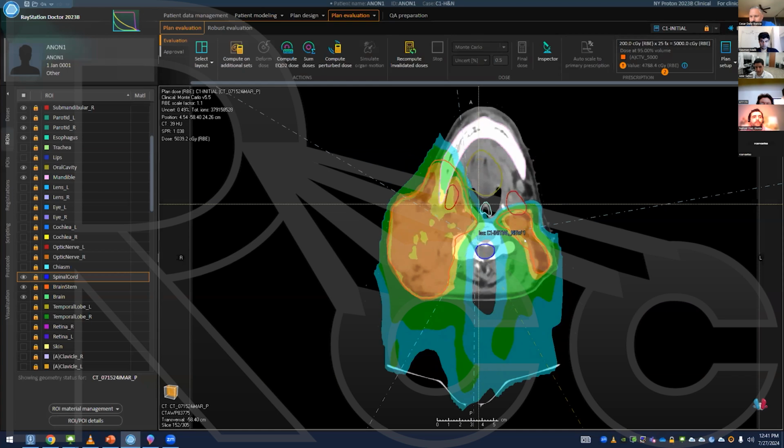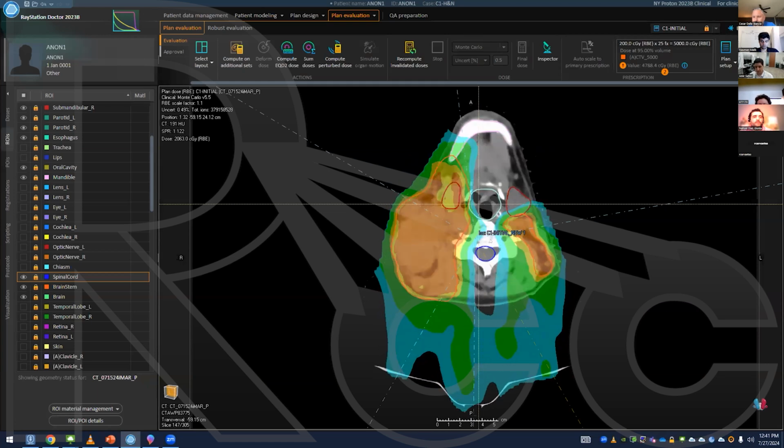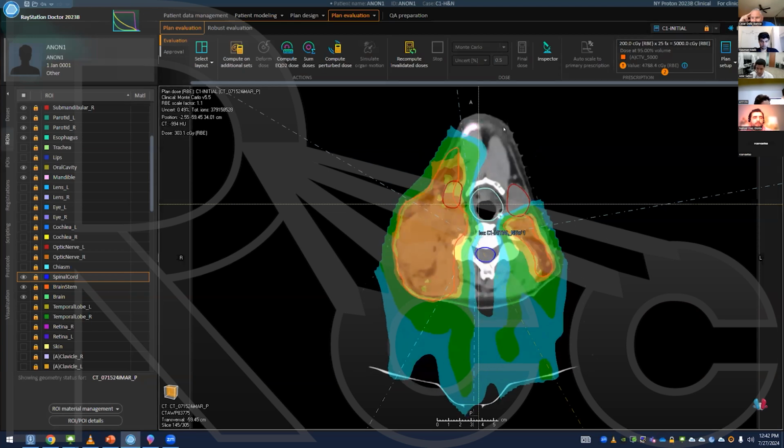Another important point, which applies to IMRT and protons, is the cord. So at really good centers, Princess Margaret, Memorial Sloan Kettering, you want to keep the dose really strongly off the spinal canal. In a 70 gray plan, ultimately, you should really not have more than a D max of about 35 gray to your spinal cord. You really want to aggressively push this, and I encourage you to do this at your centers too. So in this plan that's gone up to 50, 25 is nicely off the cord. So I expect when we go to 70, we'll still be able to keep this off 35.